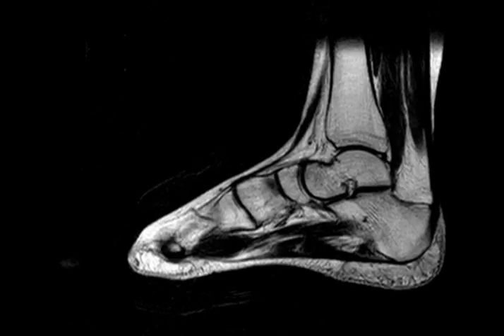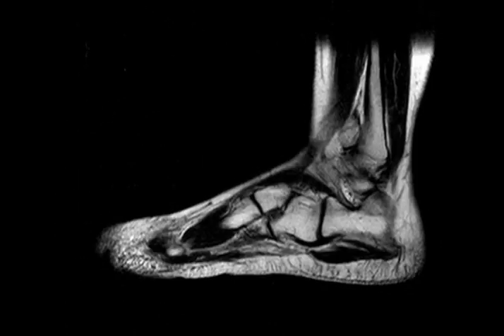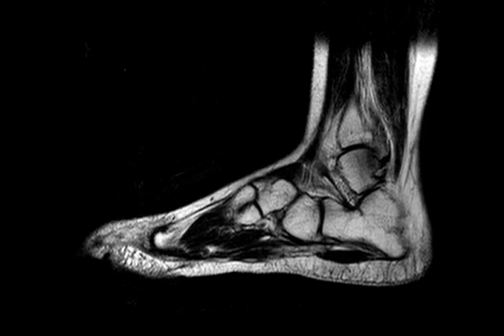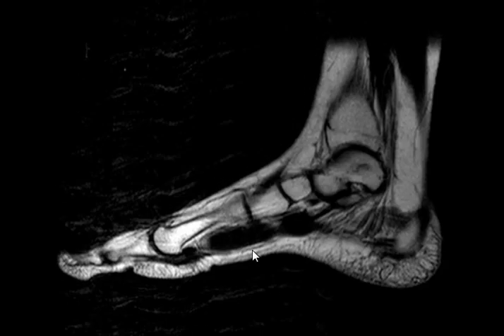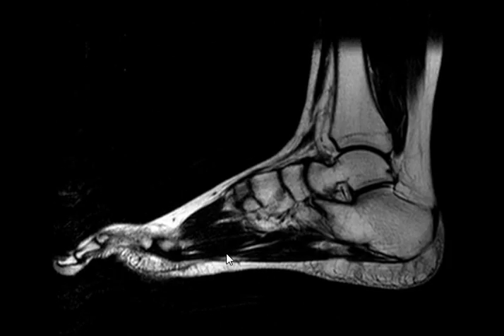ankle. يلا right foot of a 14-year-old female patient. حالي من حالك ما اعرف اي شيء عن الكيس. انا راح اشوفها وياك. يلا قلبي. أنا الأكل يا دوب بالني شوي أخطأ. والله بالامتحان يجيبوا لي هيك مش مدري وين انه انكر.